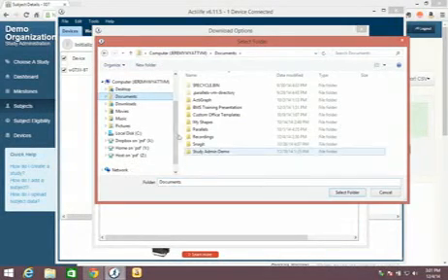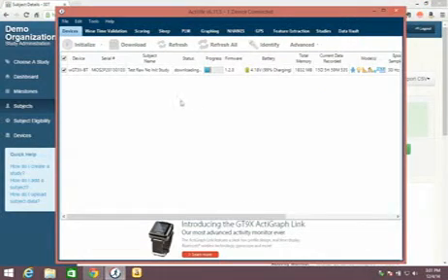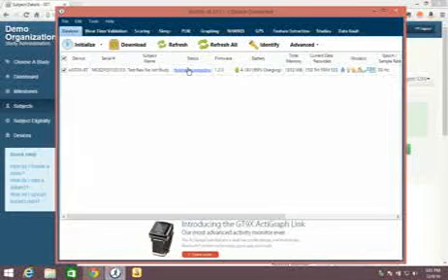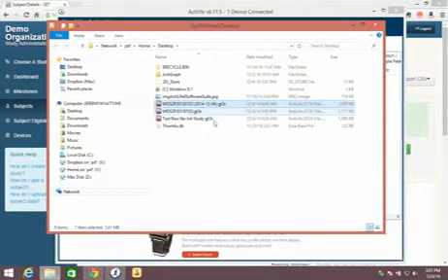Just to illustrate, I'll set up a download here for this device, which is still connected from my previous upload. That data is available right here, and I can get to it and process it in any way that I want.